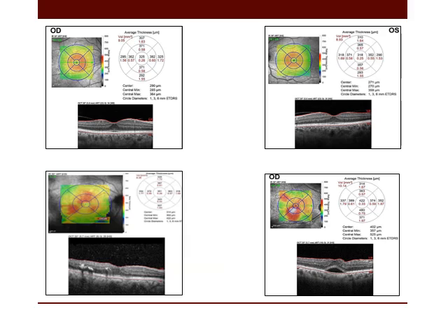what is the cut-off point that makes you know that there is a central involving or central sparing thickening? It is usually provided to you by the instrument. For example, some instruments like this one provide the measurement from beneath the retinal pigment epithelium to the retinal surface. So the average foveal thickness is about 300 micron, then the parafoveal ring 350 and perifovea is 300 again.